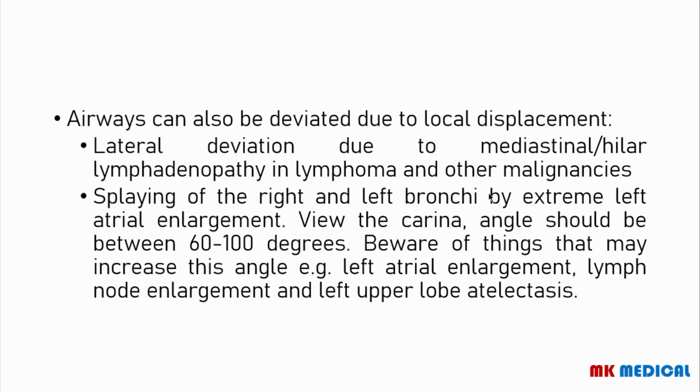So sometimes the airway can be deviated due to local displacement. Like for example, you can have some lateral deviation due to mediastinal, even hilar lymphadenopathy in cases like lymphomas, as well as other malignancies.